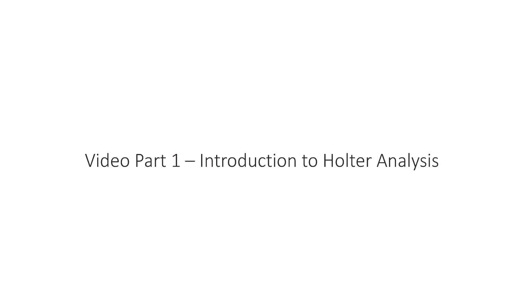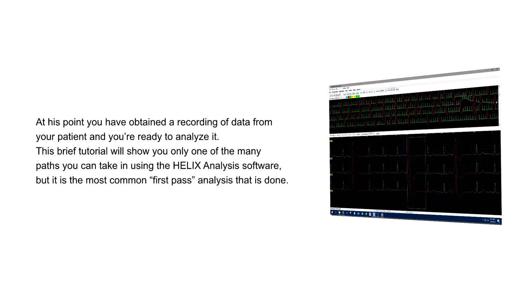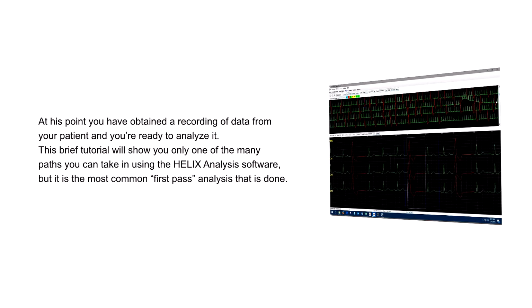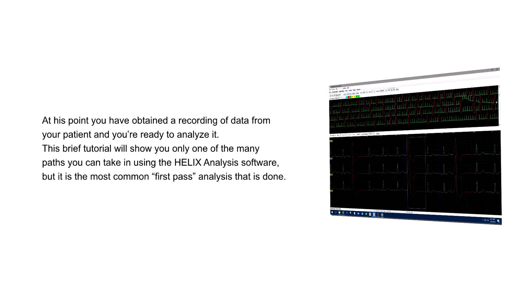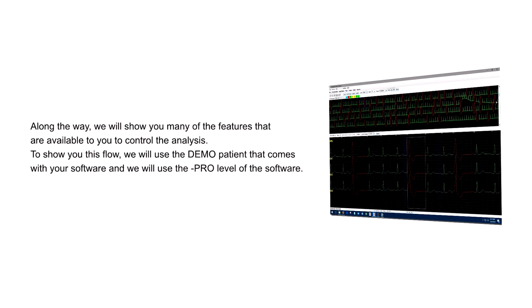Video Part 1, Introduction to Holter Analysis. At this point, you have obtained a recording of data from your patient and you're ready to analyze it. This brief tutorial will show you only one of the many paths you could take using the Helix analysis software, but it is the most common first-pass analysis that is done. Along the way, we will show you many of the features that are available to you to control the analysis.